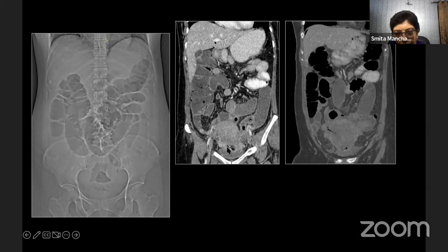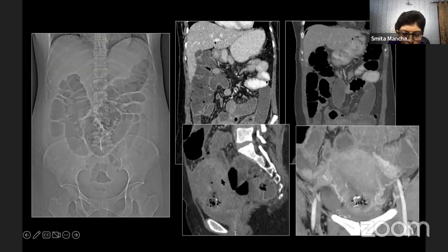In this lower part, we are seeing some mottled lucency along with some hyperdense contents and fluid air foci along with the hyperdense foci. And then this entire air foci, which we could see even on the ultrasound from the right uterine cavity, right cornu, this was going out into the peritoneal cavity. So the zoomed image to show the same. So here we can see this is within the uterine cavity, mottled appearance, hyperdense, and within the air foci.